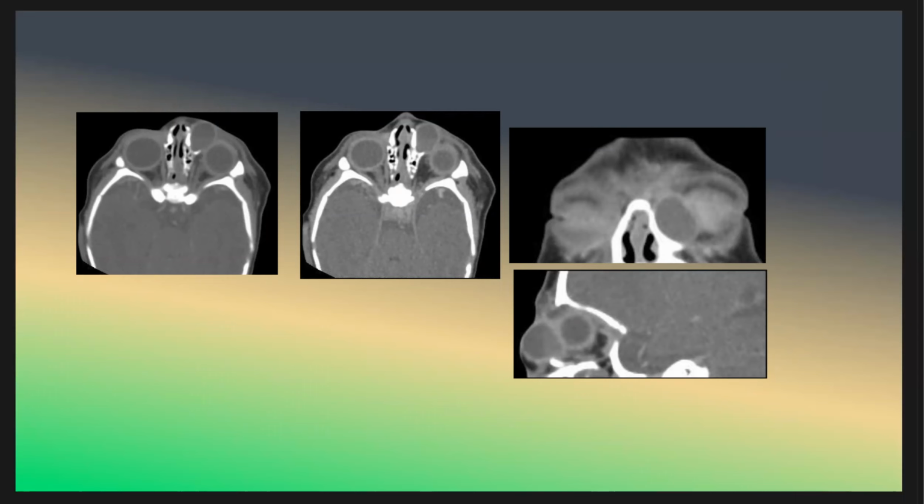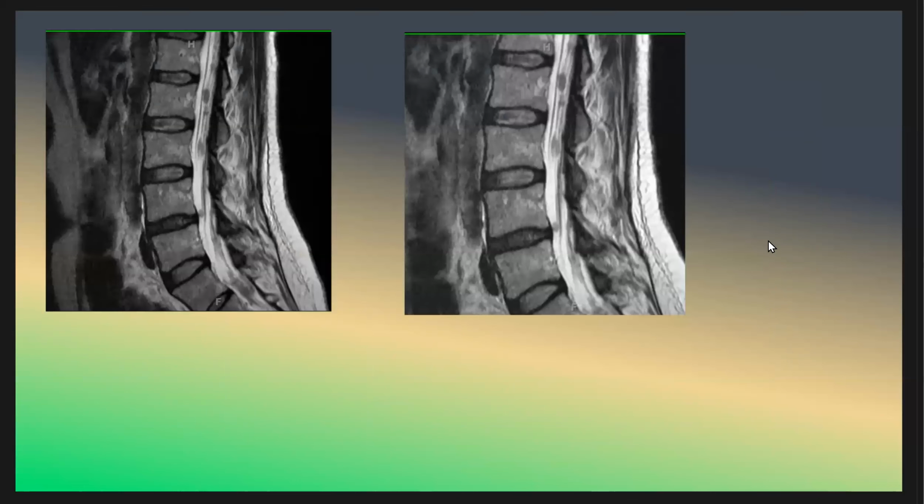These are the differential: hemangioma and dermoid cyst. And as I said, this is enhancing peripherally, and this is a dacryocystocele. So this is the differential: hemangioma, dacryocystocele, and the dermoid. And once it is enhancing here at the periphery, it is dacryocystocele. Move to the next case.